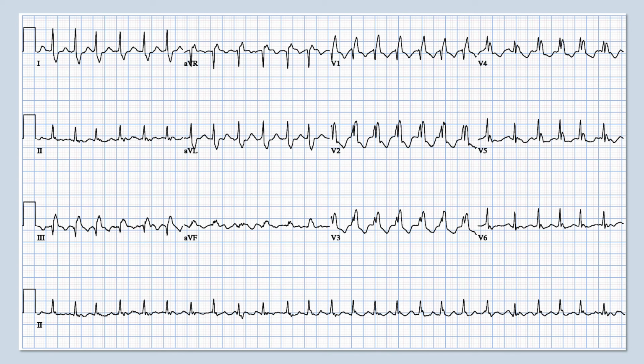Let's try this ECG as an example. This is a wide complex tachycardia which has the usual differential of VT, SVT with aberrancy, pre-excitation, and pacing. I don't see any pacing spikes. This is a very clean tracing. I don't see any noise, and this is very unusual for a pre-excitation, although we don't have a baseline ECG. And as you can see here, I don't see any clear P waves. And I don't see any termination or initiation of the tachycardia.